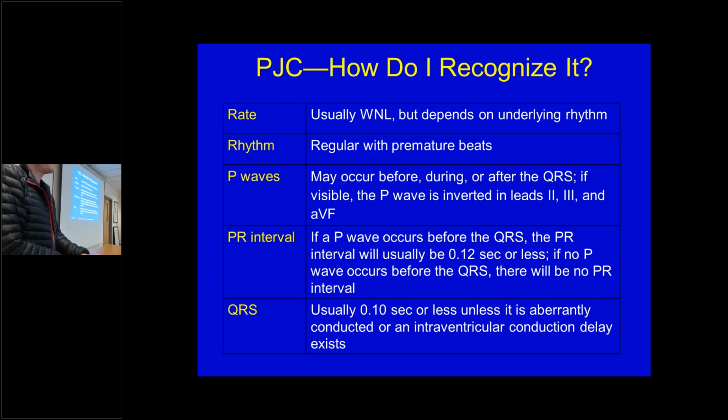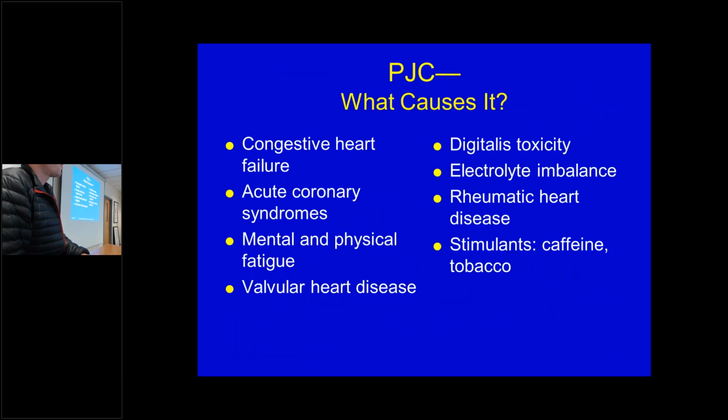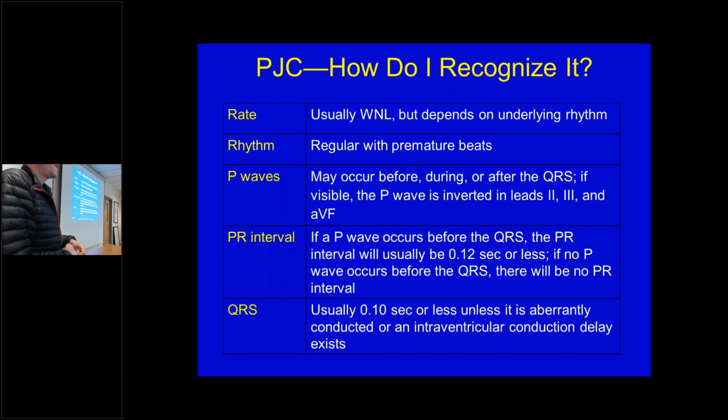That's your 5 criteria in interpreting an EKG. And then what's your interpretation? You've got all of that information. What's your interpretation?